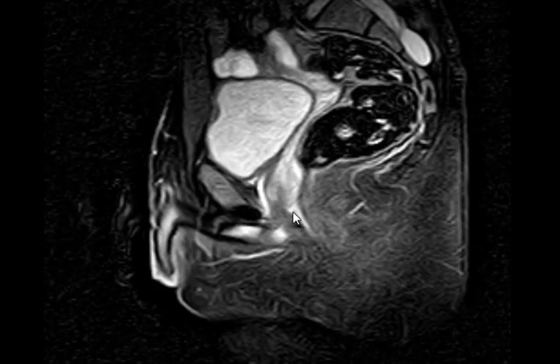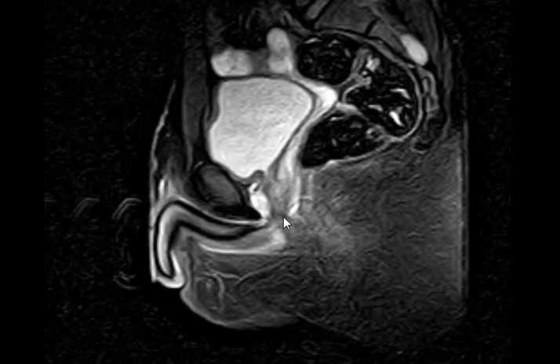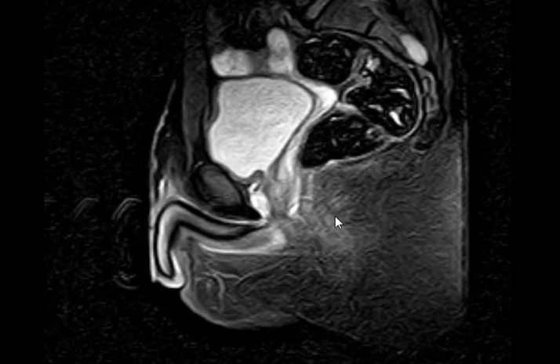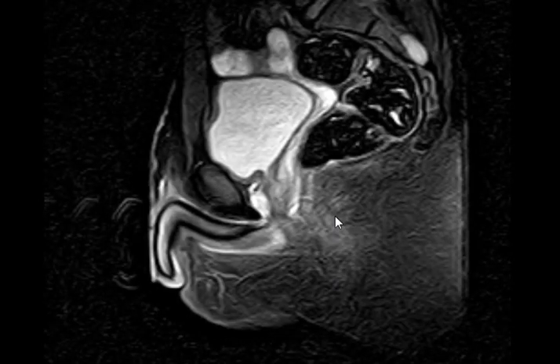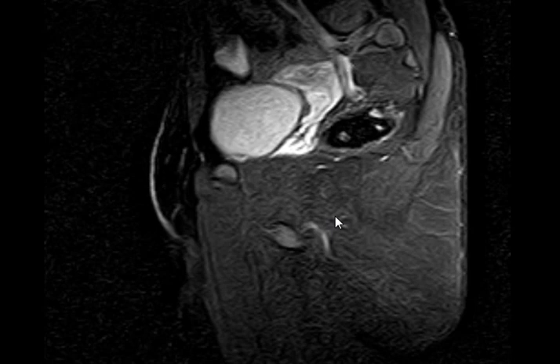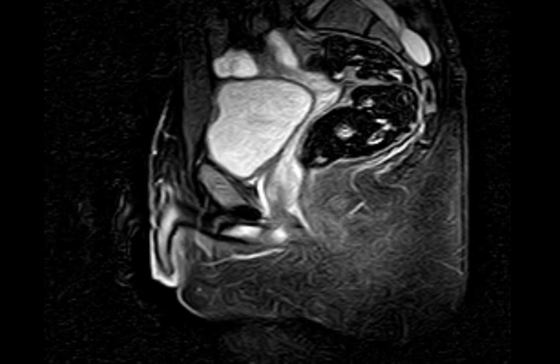And please, no one comment, okay? I think the end is here. Okay. And what about the ovaries? See, go to axial images, maybe that helps you a little bit. Or coronal, whatever you like.